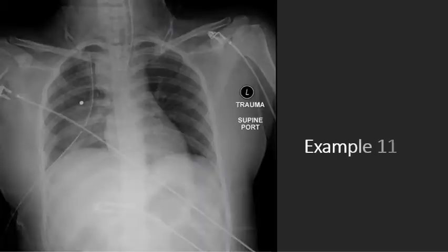So let's talk about the final x-ray here. Going through our airway, we have our trachea and carina. You see this coming in here. This is our endotracheal tube, not displaced, malrotated a little bit. You might ask yourself, why is it coming at an angle?